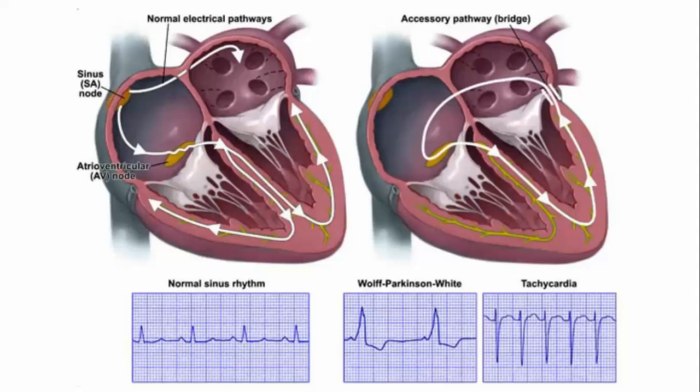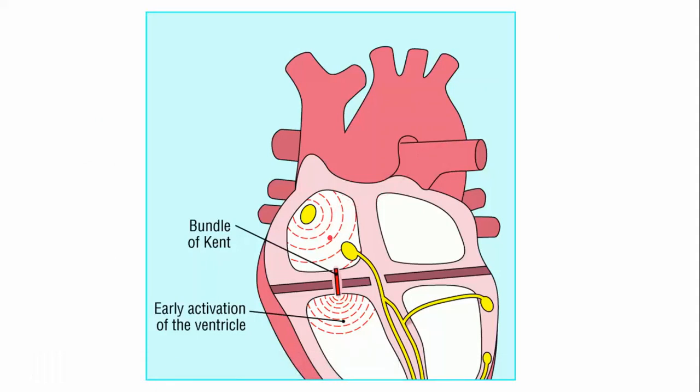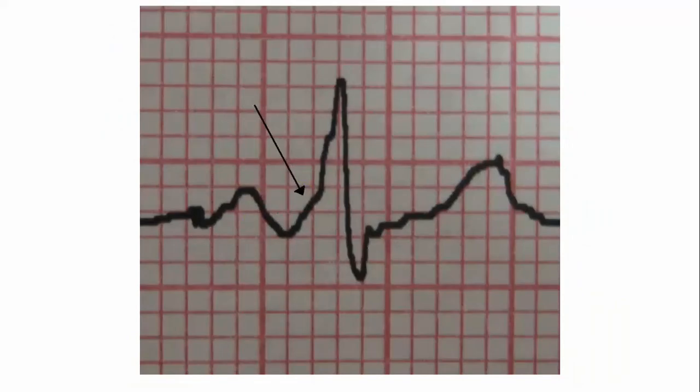Okay, I just wanted to show you that the accessory pathway can be associated with antegrade conduction in the asymptomatic patient, but also with this circular conduction pattern that's very much associated with the SVT types of presentations or the atrial fibrillation with rapid ventricular response presentations. Very good. Again, the classical delta wave that you need to see, short PR interval, early ventricular depolarization.